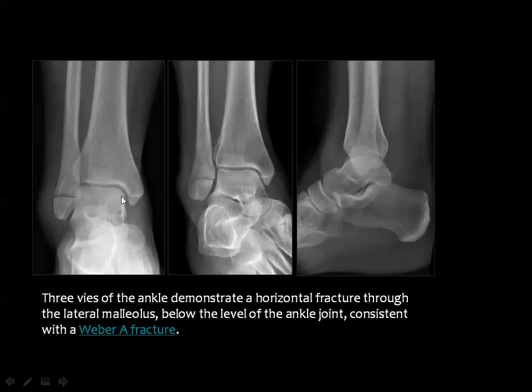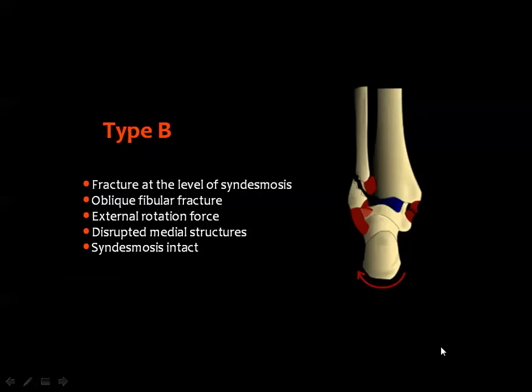Look carefully for the medial malleolus if it is fractured or not, and also look behind the ankle for fracture of the posterior aspect of the tibia. If this is fractured and this one, the fracture is known as trimalleolar fracture.